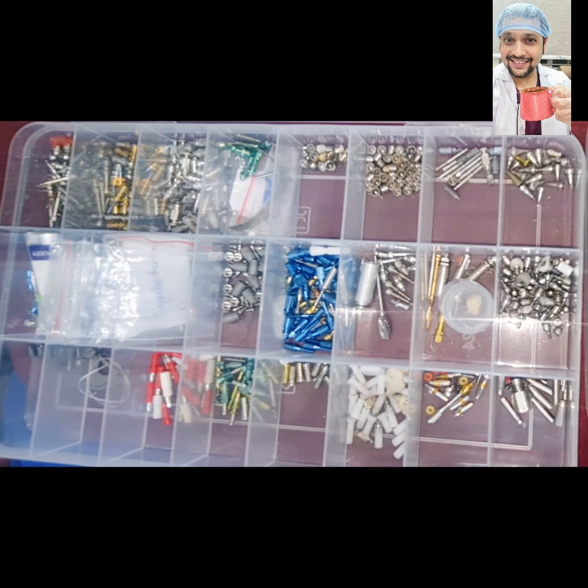So if you understand this much, then implant prosthodontics becomes slightly easier to understand and then probably execute in your private practices. I hope you all enjoyed this presentation.